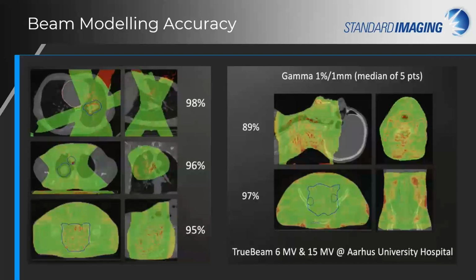So the screenshots here show an example of excellent gamma agreement for varying plan complexities. And these both have extremely tight gamma criteria of 1%, 1 millimeter. Knowing IMSure 3D has beam models that are accurate depictions of your machine, you can be confident that any dose discrepancies are algorithmic differences within the treatment planning system, and they truly should be further investigated.